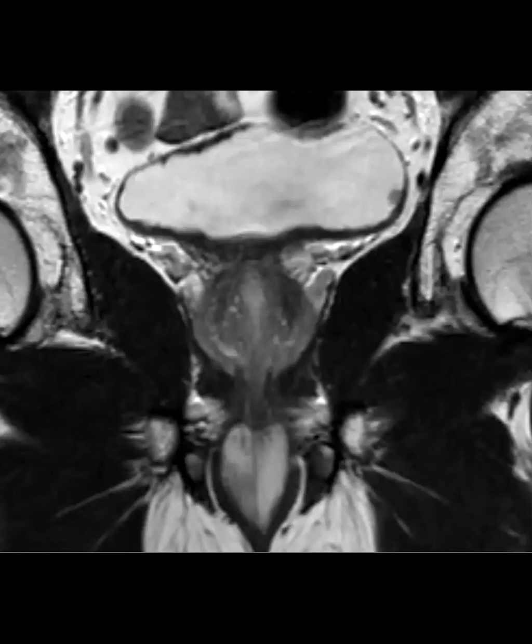Okay, great. So on the coronal, you can see the same little lesion there. This was a path-proven, actually high grade TCC, but it was without invasion. That's a nice example of how MRI, if you have good distension, doesn't look like it's invading the muscle there.